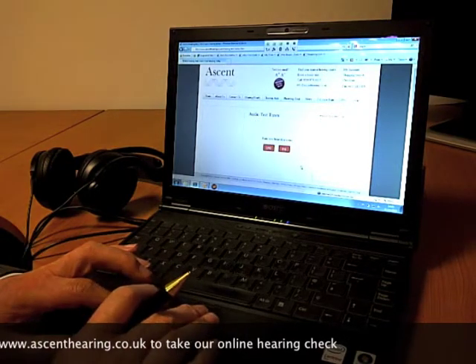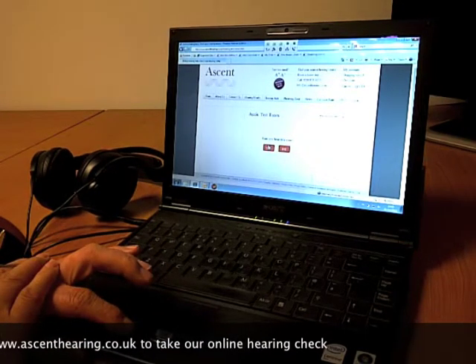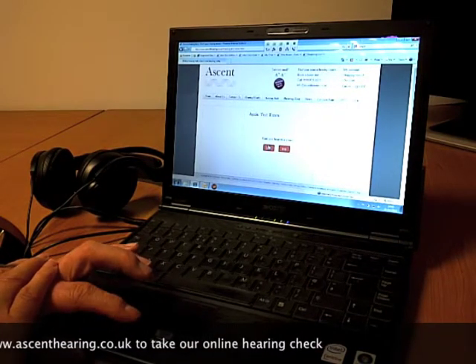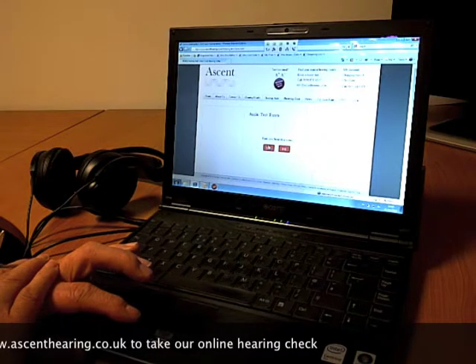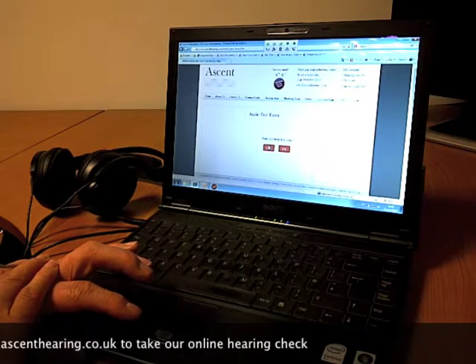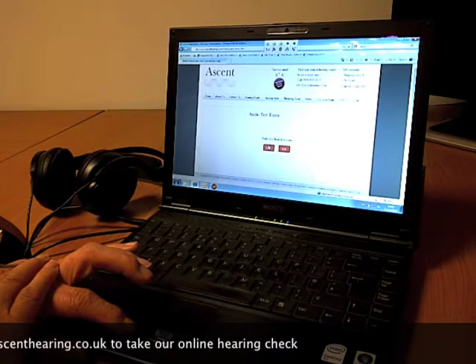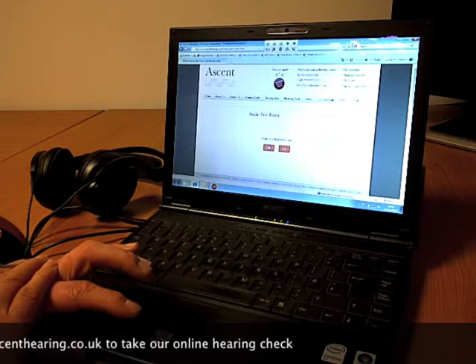So again, I start with the low pitch signal. I'm waiting for it to come. I can hear it, so I click yes. Now I'm waiting for the middle frequency tone. I'm waiting for it to come. I can hear it, and I click yes.